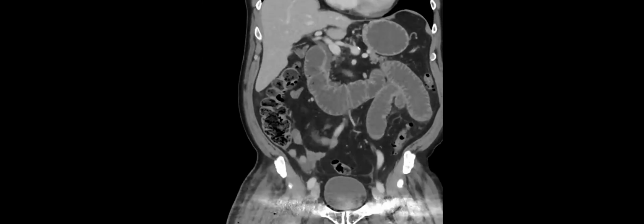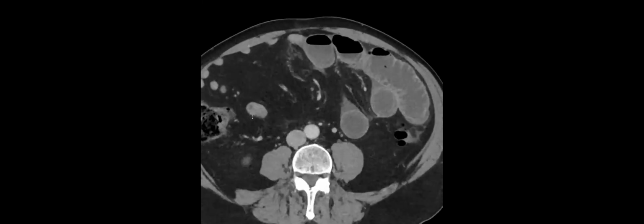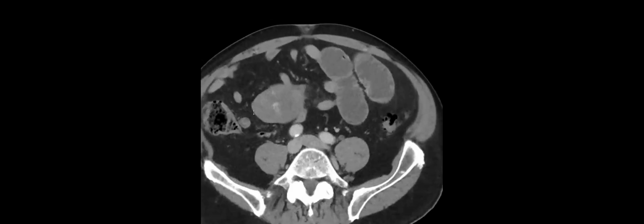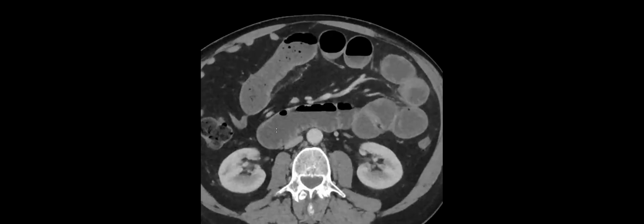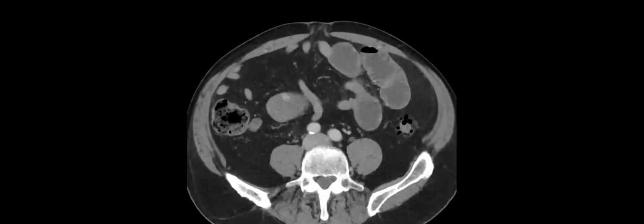Oh, I see. There's that small bowel loop that comes in and out, and then there's this big bulbous thing coming off of it that was torsed, but with a thickened base. It's pretty atypical, given maybe we're not seeing a really endophytic circular mass, but usually they're rounded lesions. This was almost nearly totally endophytic. Oh, that whole thing is the GIST. Yeah, GIST wasn't exophytic. It's endophytic, but it's the whole thing. You want to see a sagittal also? So that entire thing is Meckel's with GIST. Nice. Very cool.